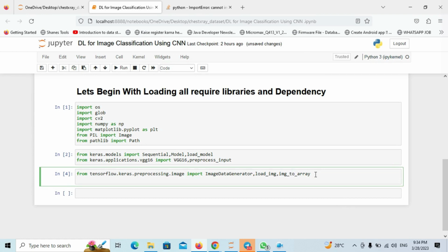Next, we write from keras.layers. If you have come across tutorials about artificial neural networks, there will be any number of layers and inputs you want to train the model on, and you have to give your network an activation function, which will classify which kind of images.